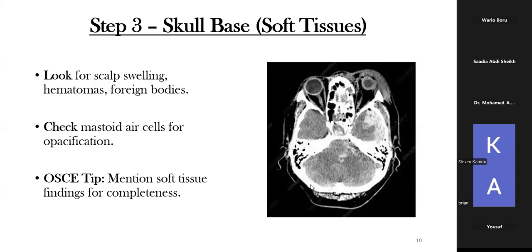How would you differentiate between temporal and parietal lobes? Most commonly, the temporal lobes are already within the middle cranial fossa. If you look at the middle cranial fossa here, Omar, you can see this is the temporal lobes. Let me see if I have a scan.